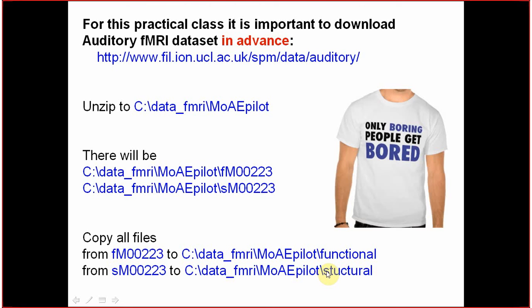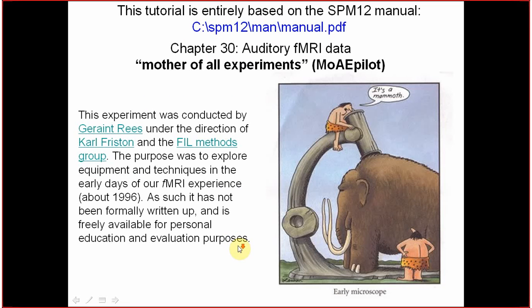It's better to do it so that you always keep your original unprocessed data, and you always can go back and compare your files with the original files if something is different, if something has been changed.